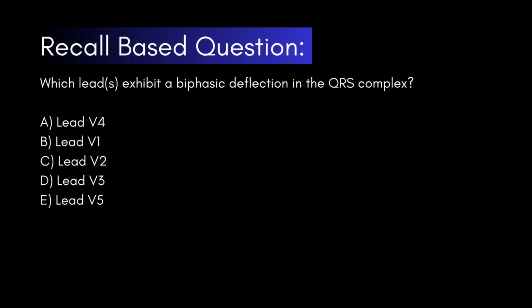Which leads exhibit a biphasic deflection in the QRS complex?